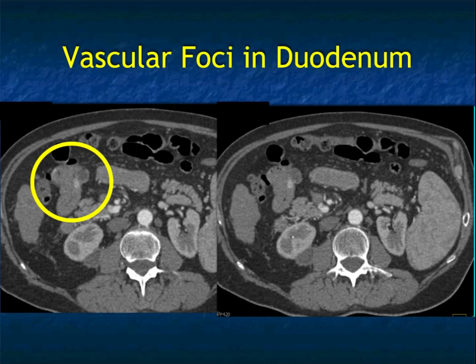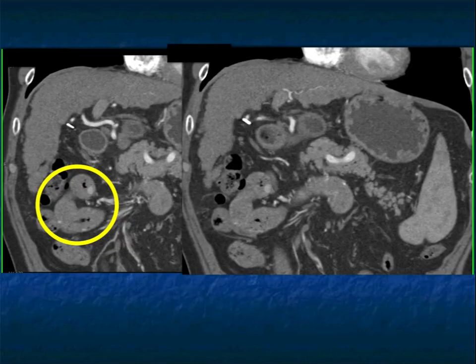Now, one of the things about angiodysplasia, it often goes unrecognized or underappreciated in the axial view. You can see on these images, and I circled it, there's some high density in the patient's duodenum. What exactly is that? Is that bleeding sites? And when you scan further down in coronal, you actually recognize there are several of those high density regions present. Are these multiple sites of bleeding? What exactly am I looking at?